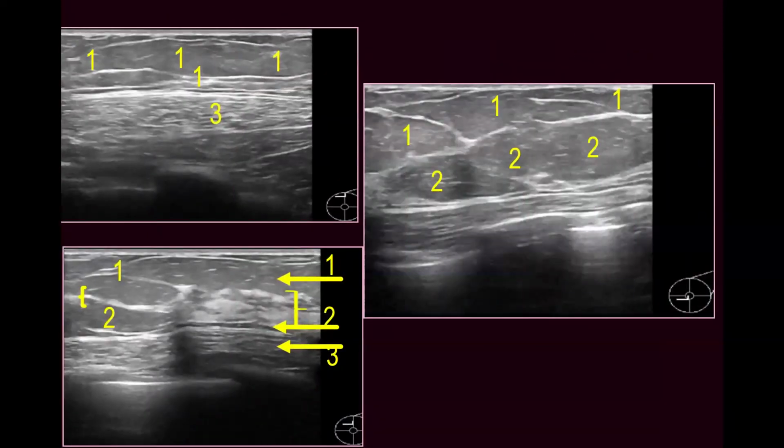While these are examples of a fatty layer. We can see, okay? All this is the pre-mammary, and this is only the mammary. You see, this is the mammary, and all this is retro-mammary. For this one here, I can see the pre-mammary zone and part of the mammary zone.